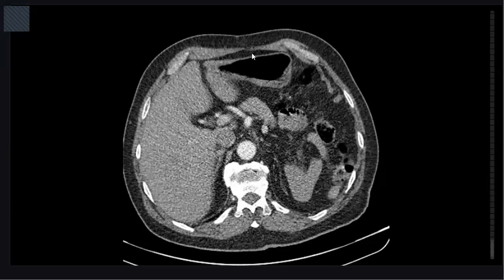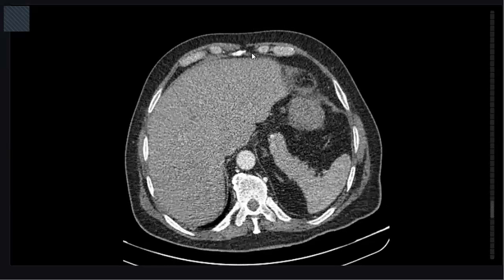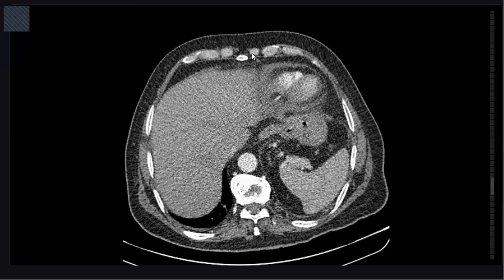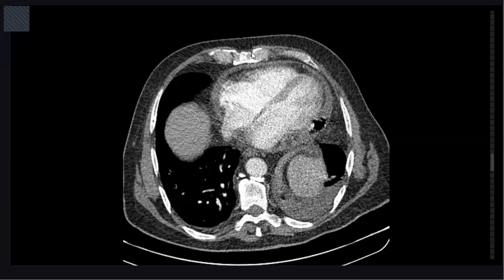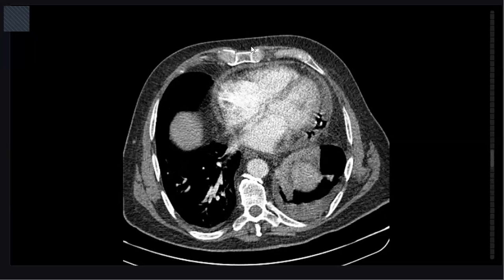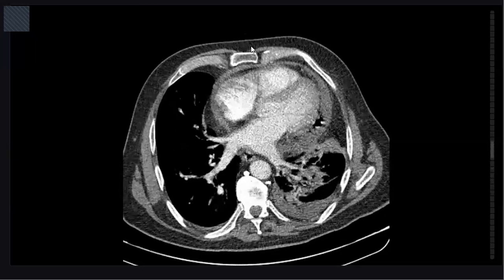Yes, I think this is the last image of the study. It has the other abdominal cuts. I looked through it. Going back to the area of the heart, there is evidence of moderate amount of pericardial effusion, and also there is gas lucency seen at the posterior aspect of the pericardial space.